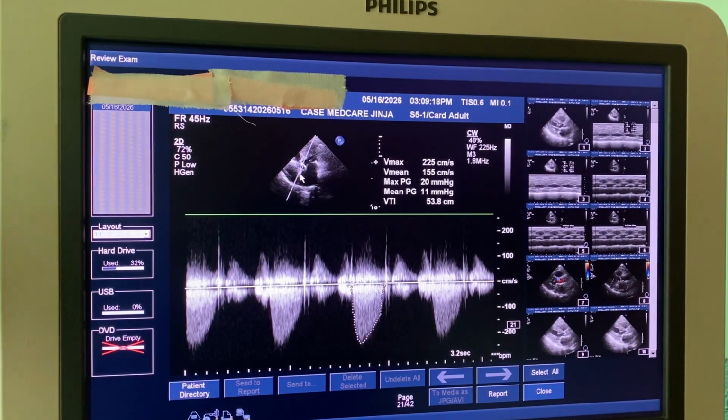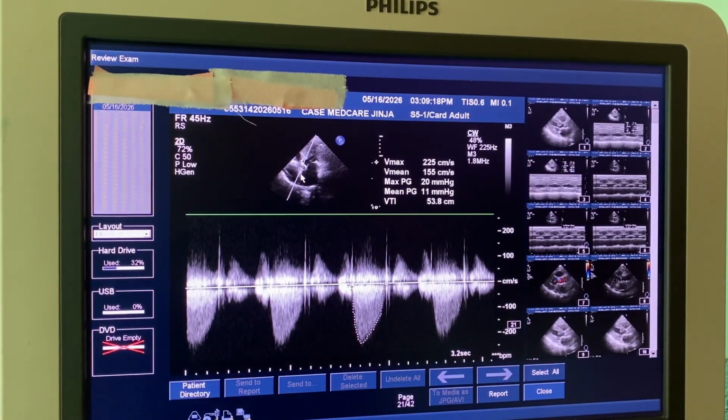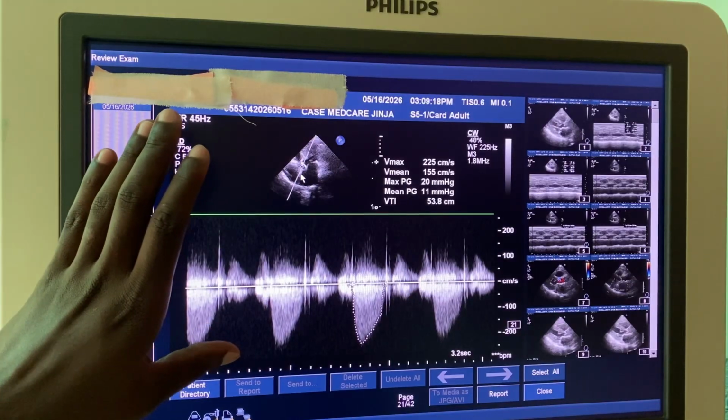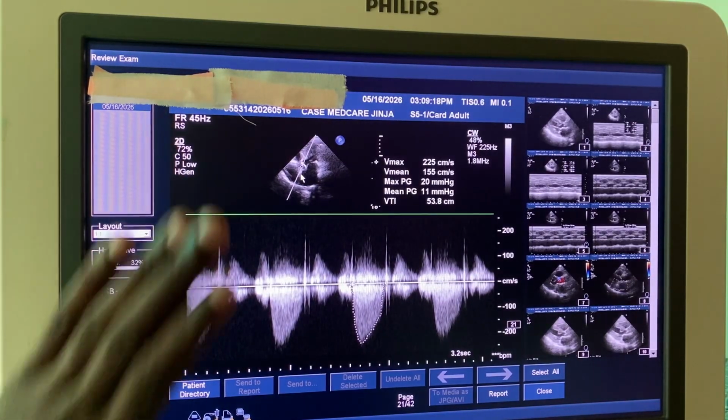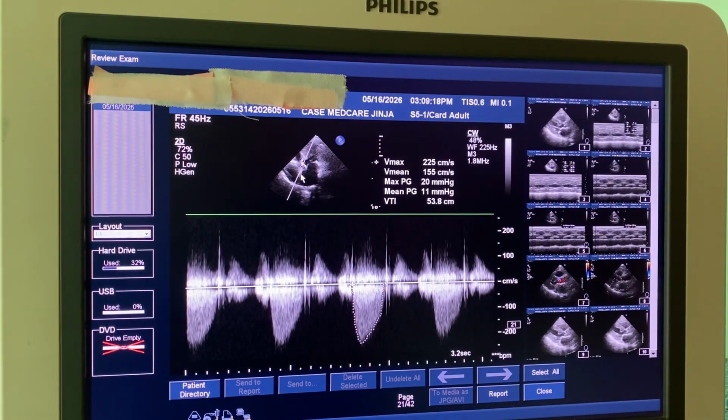This was degenerative valvular disease with a lot of calcification, severe calcification on the mitral valve and the aortic valve, but with no regurgitation. Otherwise, there are contraindications where this continuity equation we have used cannot be used, where there is regurgitation. For example, if there was mitral regurgitation, I wouldn't have used it. I used it because there was no regurgitation.